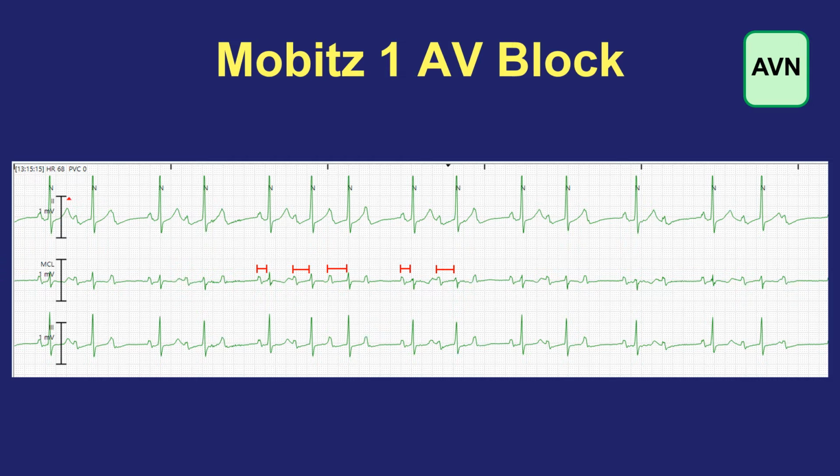The difference here is that you're seeing different ratios at different times, probably because of changing autonomic tone, which we'll review in a moment. And here you see there's 4:3 Wenckebach, 3:2 Wenckebach, and even 2:1 Wenckebach on this same strip. But it's all Mobitz 1 because the PR interval on adjacent beats is clearly prolonging. Again, that suggests that the block is happening in the AV node, not an emergency, not something that you would expect to progress suddenly and unpredictably.